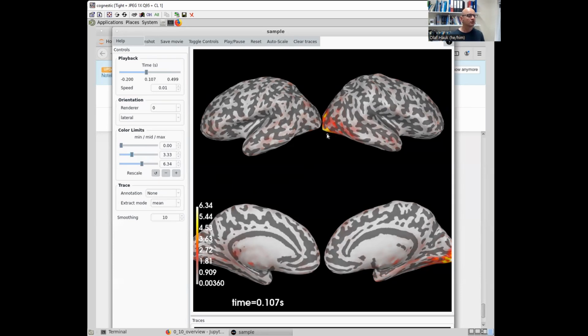The visually evoked response is probably not that widespread. It's probably more focal here in visual cortex, but with EEG and MEG, you have limited spatial resolution. You get a blurred version of the true underlying cortical sources. That is a big topic that we will deal with in a separate session. So there are ways, at least, to describe the spatial resolution of your source estimation methods. But this is at least the kind of resolution you can expect, in a best case scenario, because here we can use combined EEG and MEG.